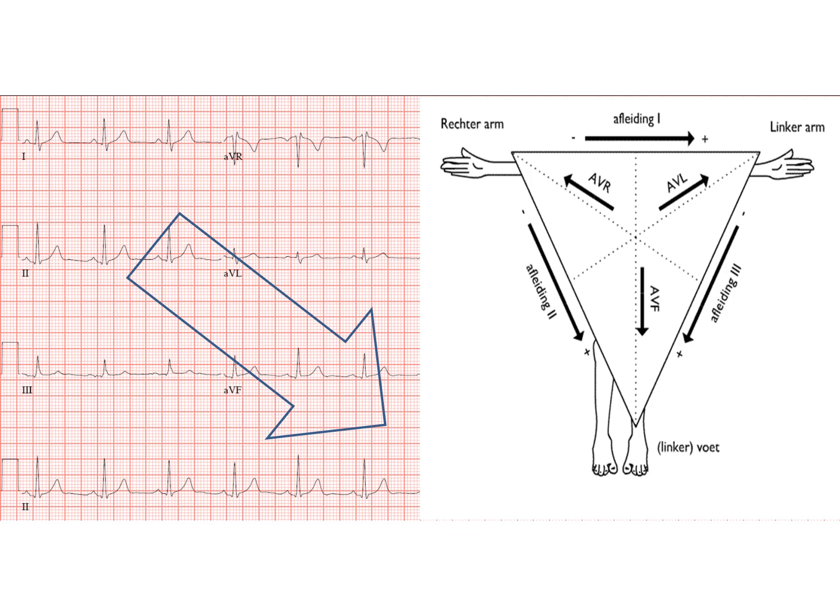Okay? If the electricity is going down and towards the left, we would expect lead AVF to be positive, because AVF is a purely vertical lead that only cares what electricity is doing in the vertical plane, and it turns positive when the electricity is going down, as is the case here. And if we look at lead AVF, we will notice, in fact, it is positive.